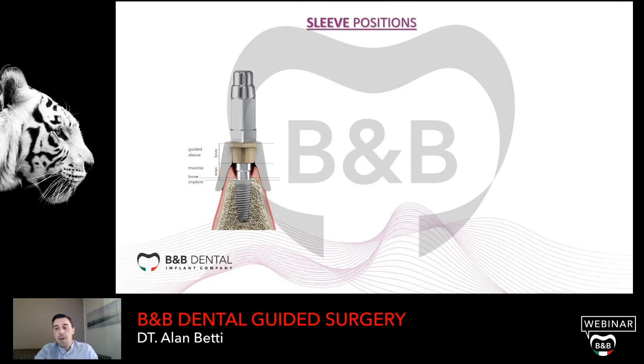Because 5 millimeters is the height of the sleeve, so we have 5 millimeters to drive the drill into the sleeve in the proper position, and 4 millimeters is the space expected for the gingiva. 1, 2, 3, 4 millimeters is always the same.